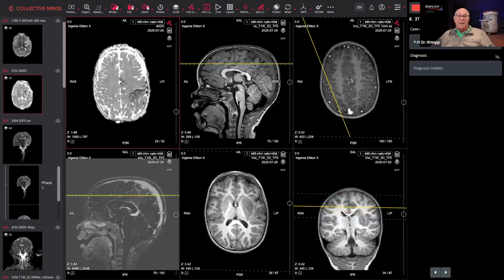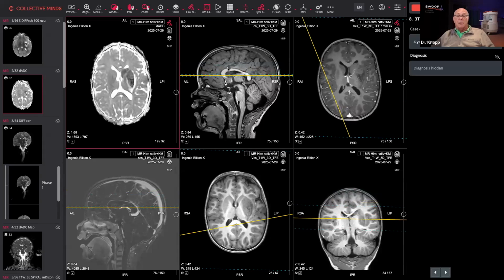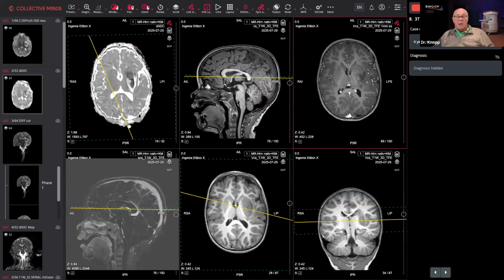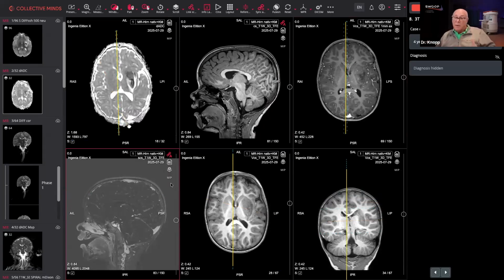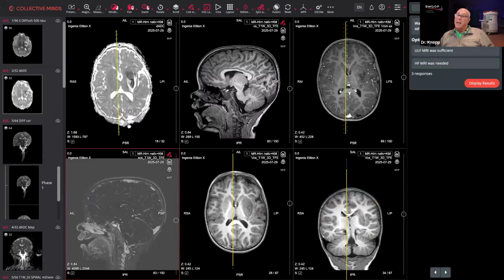So we're seeing evidence of that acute ischemia here, as well as the signal change that we've seen both on the T2 and on the T1 in the basal ganglionic region. In my mind, it's confirming what we saw on the Swoop scan itself. Hemant, anything to add before we jump to the next question to see if anyone thinks that this added anything or not? No, thanks. Okay.